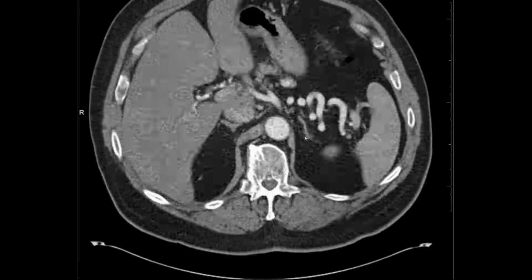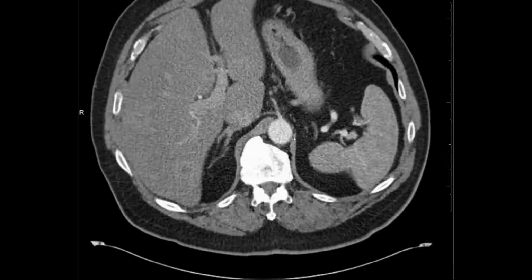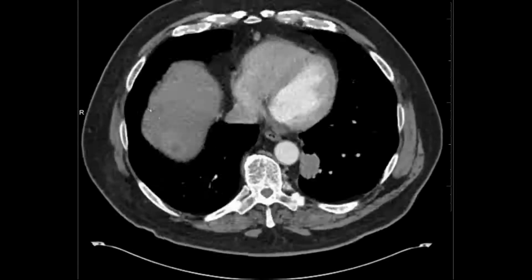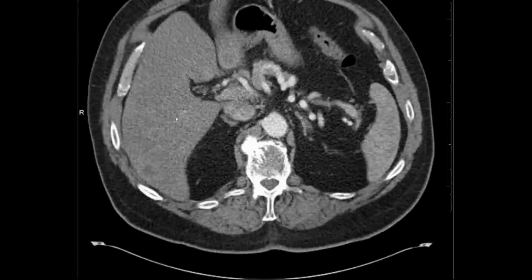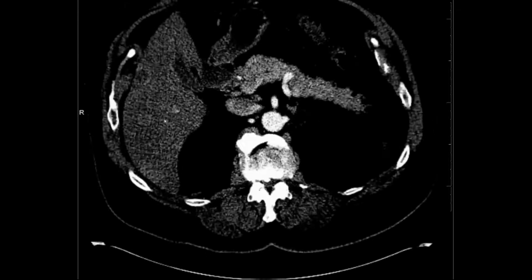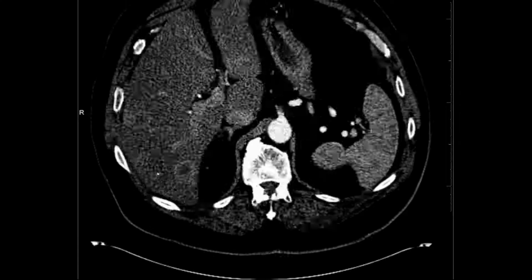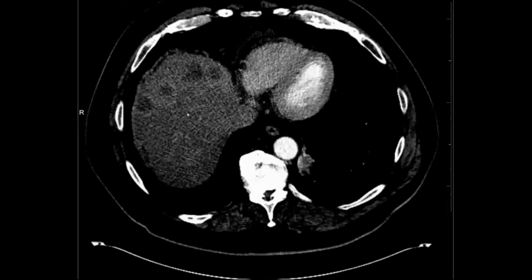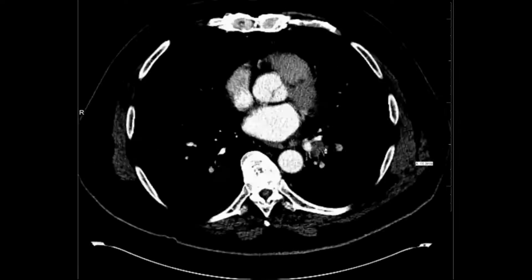Now looking in the abdomen, immediately I look at the Y-shaped adrenal glands here, and then something should be catching your eye. There are all these rim-enhancing metastatic lesions throughout the liver. They really kind of pop out with that liver window. So that's essentially why we do it. So this person has definite metastatic disease to the liver.